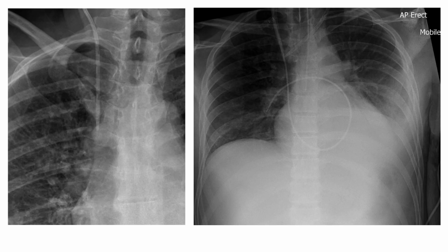These two chest x-rays show us two different central venous catheters. Here we have a triple lumen catheter which is in the SVC just above the right atrium, and over here we have a pulmonary artery catheter or a Swan-Ganz catheter. Both of these are in the venous system, however they're measuring oxygen levels that are quite different.